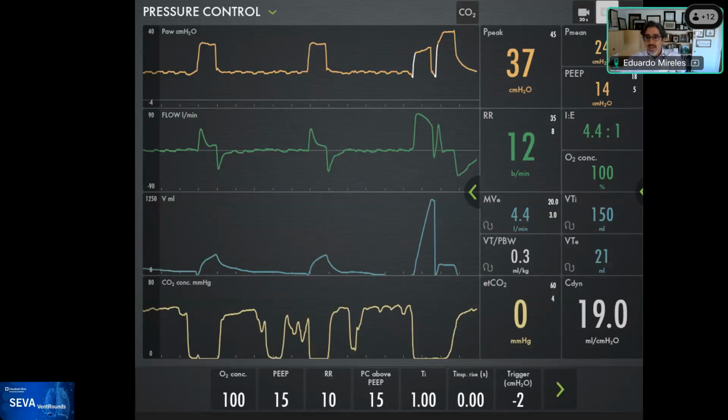Well, the curare cleft is different, and we can talk about that in a second, Ariel. But now I'm going to show you. So this is in 2 centimeters of water. And now watch the waveform. And this becomes even more evident than what we saw before. So this is kind of confirmatory to our analysis before. That's why this is the case that keeps on giving. So we recognize, right, that this is inhalation. So I'm going to follow it back. Just follow my line. I'm trying to be as straight as I can.